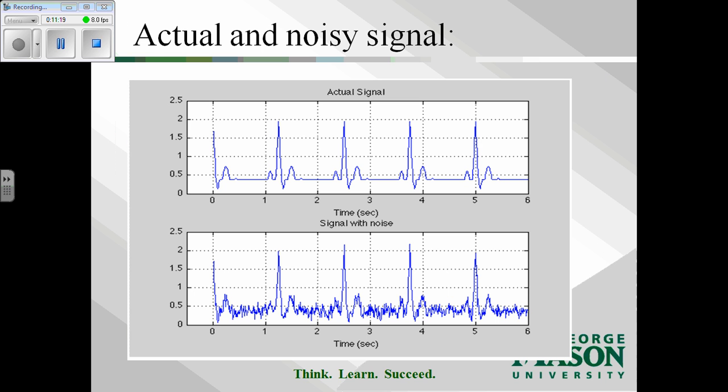But what if it gets a little noisier? Okay, here we've already lost our T, and in some cases our P waves. You can kind of see it, but it's starting to not look so much like an ECG. We can still easily determine our peaks to do a beat count, but Dr. Katona showed us some really cool things that you could diagnose just by looking at the shape of the ECG curve. We've lost that information down here.